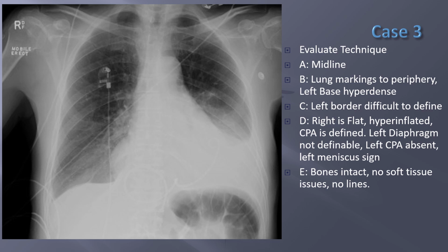All right, now that I got my technique evaluation down, I'm going to move on to A. So I can see a little bit of a trachea here. I think I see maybe the carina about there.